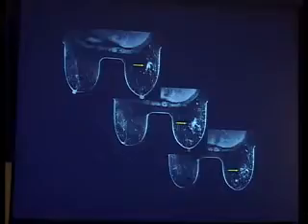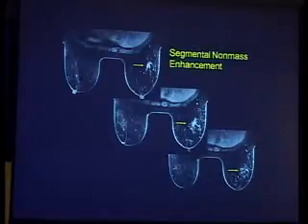Arborization of a tree, as if you pour gadolinium in the ductal system. So I think this is a good example of non-mass enhancement, segmental. There it is. That's the correlate to her cancer and to her calcifications.